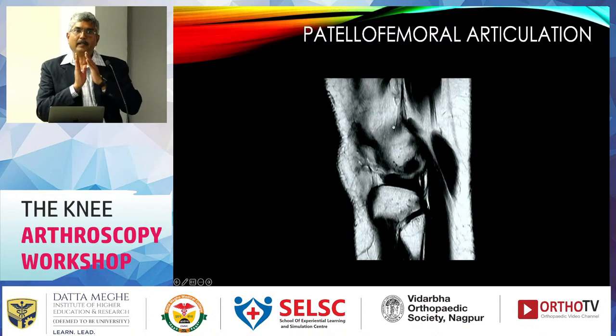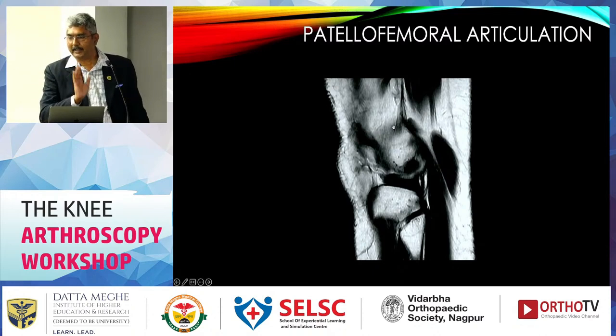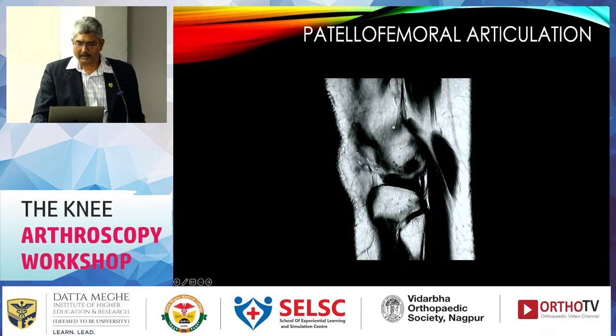But the hyaline cartilage will be a little bright on T2. To make out that little brightness, we may have to go ahead with some different sequences, or with the GRE images which are already there with you. GRE images show pathologies of the ligaments and menisci better. However, I am more comfortable with fat-suppressed PD images.